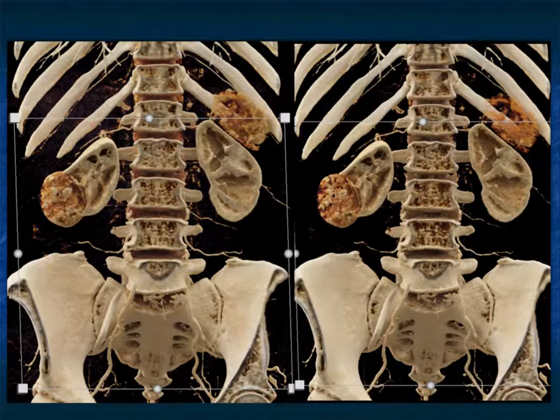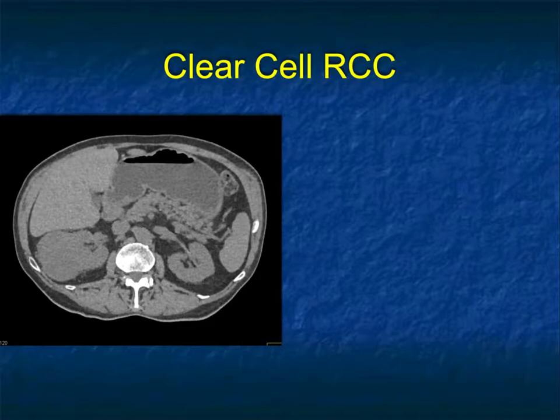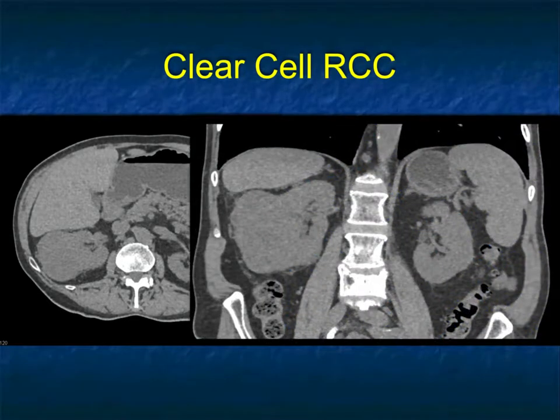You also create the 3D maps, particularly from the early phase imaging, showing the tumor and the interface to the kidney. You can see why this would be a great candidate for partial nephrectomy. There's the kidney viewed from behind, and you see the patient's right renal mass. And that is your good example of a clear cell.